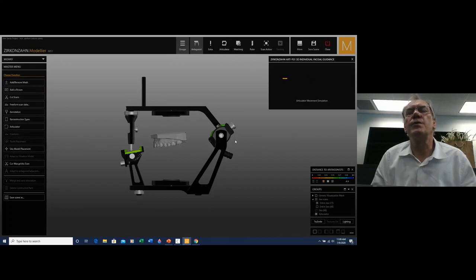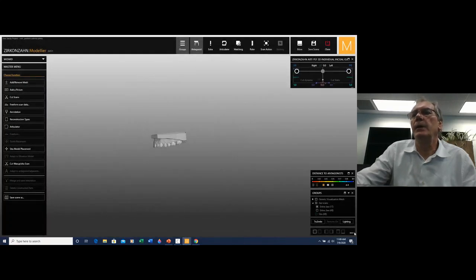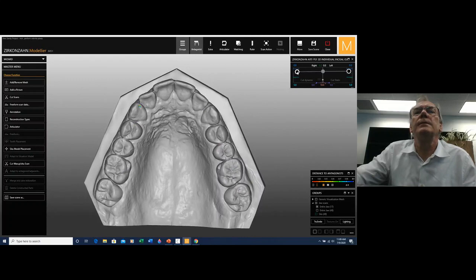I think that we are almost through. Maybe there's another little touching to do, but and here we go. I'm going to flip it over. My contacts are there, and we go. 1, 2, 3, 4. Just a little bit.